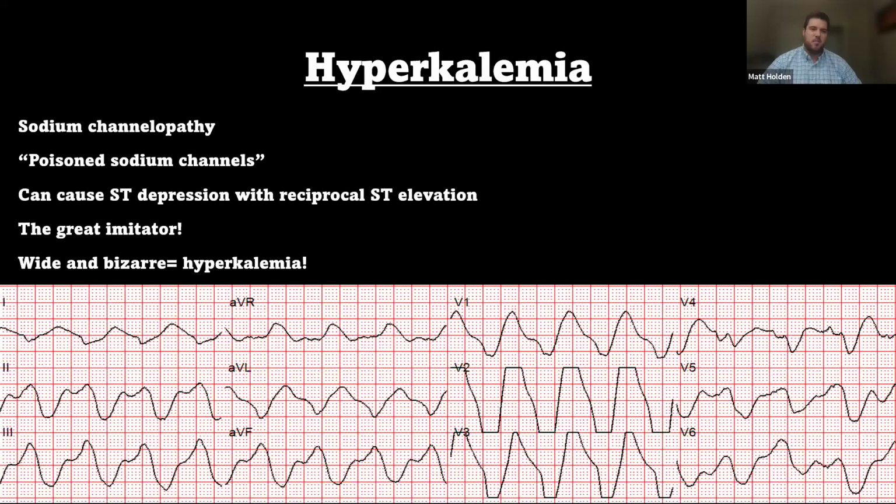This is thought to be a poison of sodium channels, or a sodium channelopathy. And as you can see, it does cause some ST depression and reciprocal elevation. But one of the big pearls I like to say with hyperkalemia: if you look at it and say, that is wide and bizarre, it is probably hyperkalemia. And this is a great example of this.